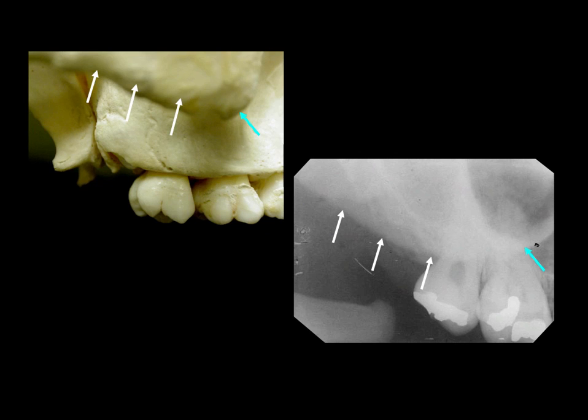Again, a posterior periapical radiograph. And just to remind you about the zygoma appearance, here we see the U shape of the zygomatic process of the maxilla, and here we see the lower edge of the zygoma going back into the zygomatic arch.